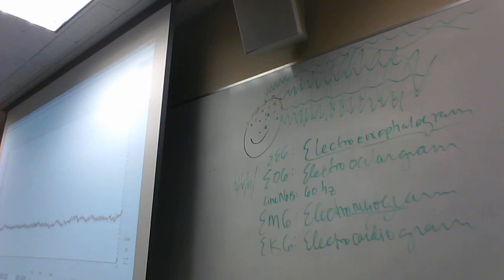Okay? So what we do is we then subtract the average. Mathematically, you take the amplitude measurement from a period in time, let's say between these latencies, and you can mathematically just quantify it. What's the average electrical value there in this line versus the average electrical value here in this line?